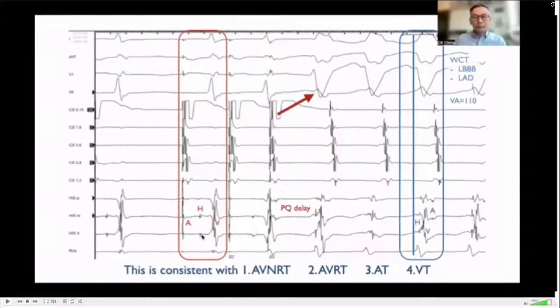Previously, it was pre-QRS. It has moved within the ventricular EGMs. In fact, the HV interval becomes negative. With these features in mind, one can rule out an AVNRT because you would need a positive HV interval. At the same time, you can rule out an atrial tachycardia.